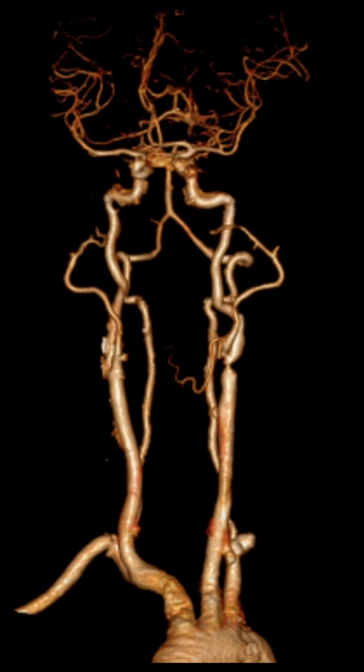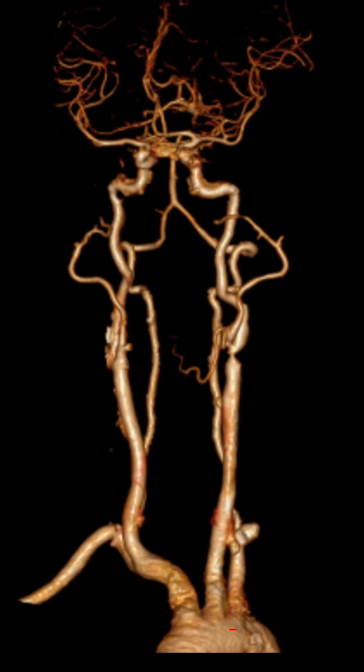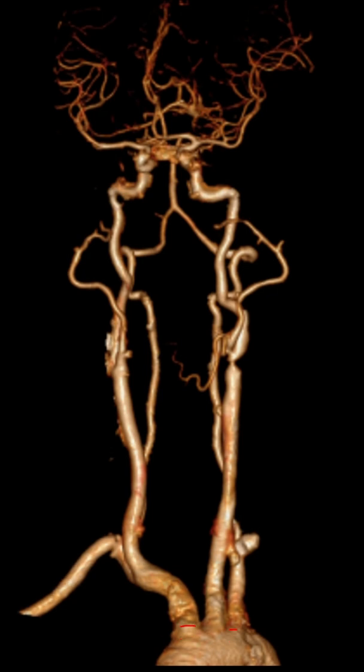One of the main points which everybody should remember is, when you are doing a CT angiogram for stroke, always include the arch of aorta also, because of two reasons. One, we should know the origin of the main vessels from the arch of aorta, based on which you can decide whether intervention is feasible or not, or the technical difficulties if there are any anomalies in the arch of aorta. Second, whether there is any large atheromatous plaque in the arch of aorta, which might be the cause for the stroke. So always tell the radio technician to include the arch of aorta also. So this is the arch of aorta. Clear? So now we'll try to identify vessels one by one.